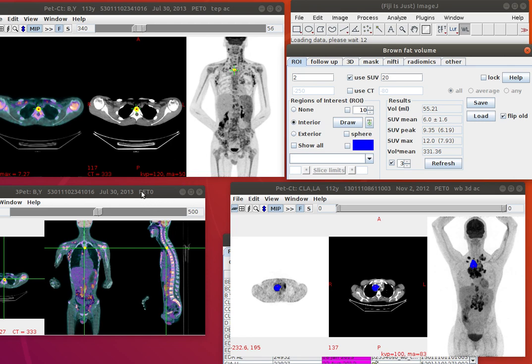Now in this case, maybe I want in fact to go to the 3 view. Look, go through the tumor, and when I click here, click on the brown fat, it remains where I've chosen. It's not on the red dot anymore.